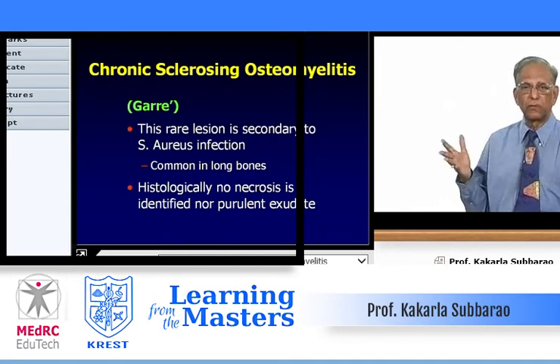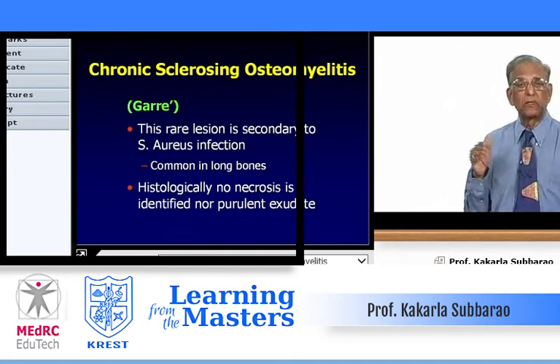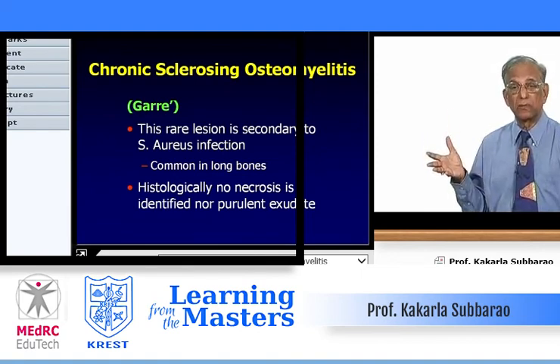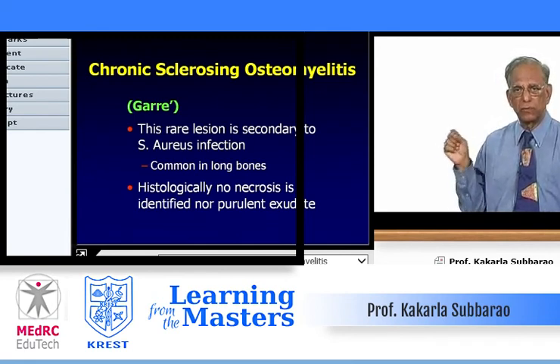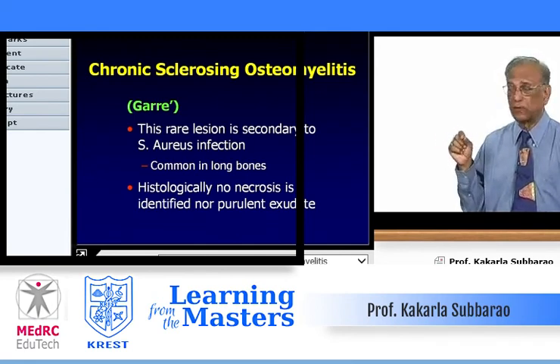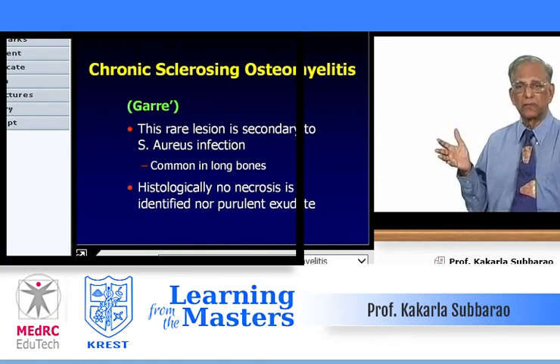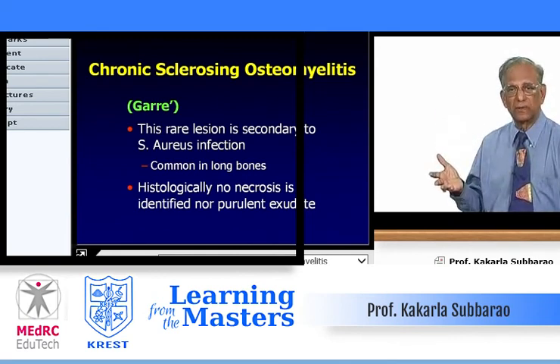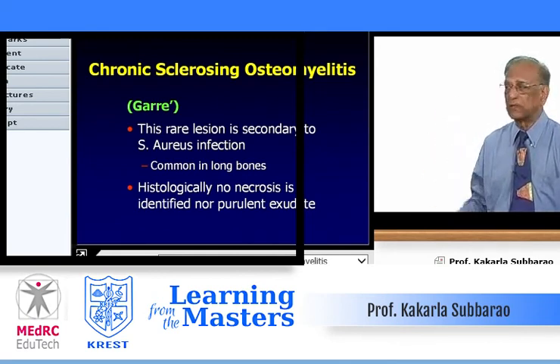Generally, osteomyelitis could be divided into acute, subacute, and chronic. This is chronic. But in chronic osteomyelitis, we generally diagnose in tubular bones if there is a sequestrum surrounded by involucrum. Here, there may be small involucra or even sequestra, but most of it is because of the reactive bone that engulfs the small lucent areas.